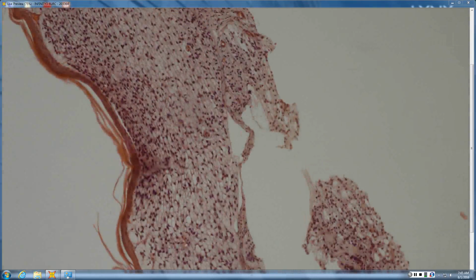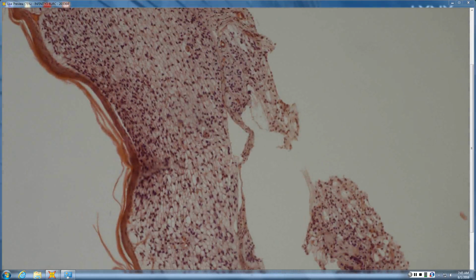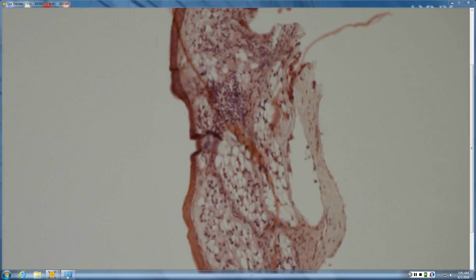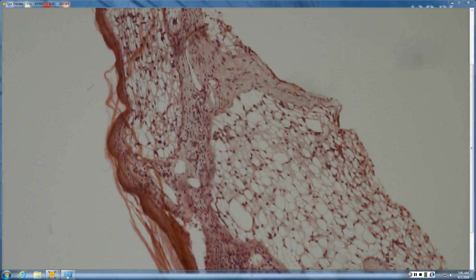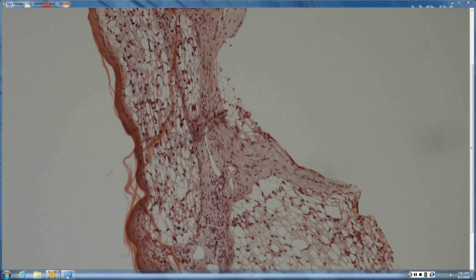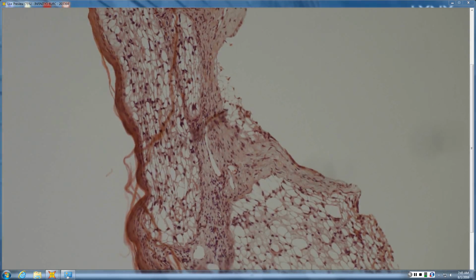So now you start thinking of epidermal tumors which would be clear cell. Any chance that this is a clear cell acanthoma? I don't think so, it's too atypical and irregular. I agree. There's nuclear atypia, and this kind of vacuolated signet ring type cell you just don't get in clear cell acanthoma. So clear cell Bowen's.